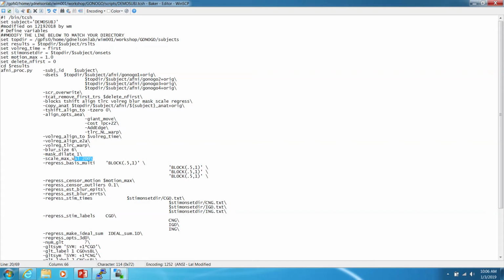And the other thing that it does in that step is if there are any signal values above 200, which is huge, that's like many, many, many standard deviations effectively from the signal. It depends a little bit on your experiment. But basically, if it gets a value of above 200, it just sets it to 200. So it's Winsorizing the signal, technically speaking. But that helps reduce really random noise. We're not talking large values in change, so that's pretty reasonable.